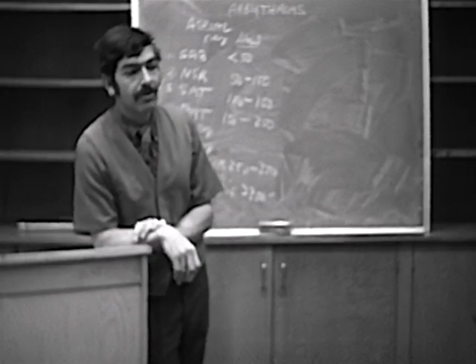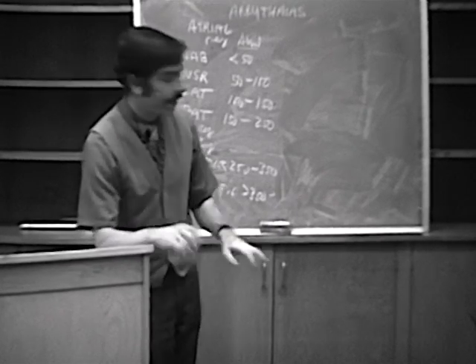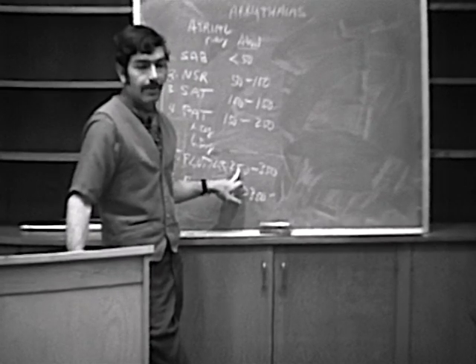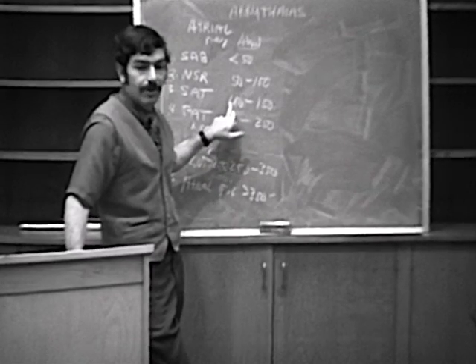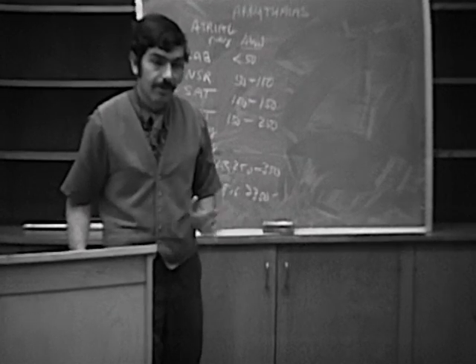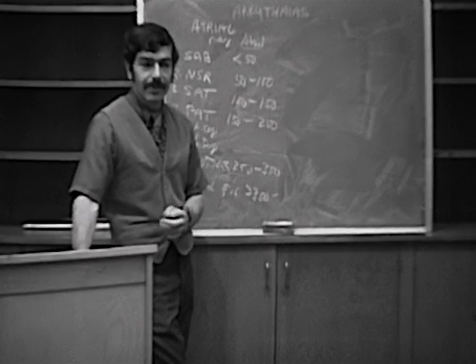Not at all, right? Because the most common way flutter appears is how? Low. Yeah, with 2-to-1 block. So if you have a flutter with an atrial rate of 300, you wind up with an electrocardiogram having a rate of 150, and it's right in your sinus tach range. Right? So you have to see what is P waves, and it's very difficult to differentiate when you have a very rapid tracing, as I'm sure you all know from bitter experience.